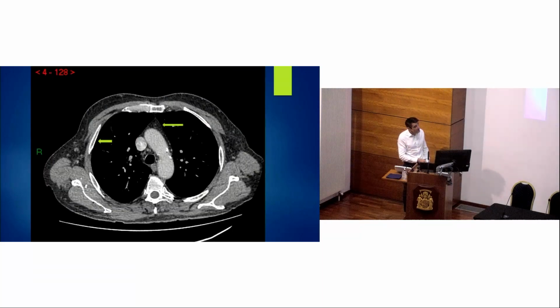So it's important to realise that this is a healthy patient, normal pleura, and we can't really appreciate pleura on CT. So for example, here where this arrow is, this is the aortic arch and the SVC, the trachea, the black bits of the lungs. The black bit in the middle here is fat within the mediastinum. And between the black of the lung and the black of the mediastinum, there's no definable structure. Similarly, deep to the ribs, we don't see any tissue in the normal, healthy state.